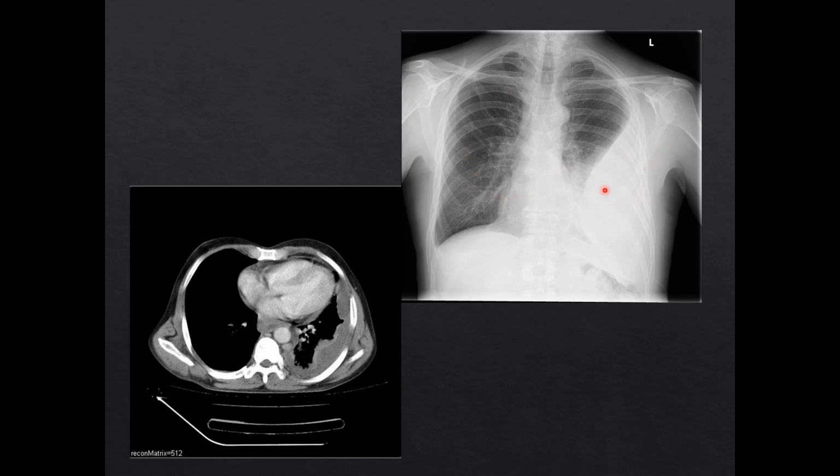Looking at the chest x-ray, for one, pleural effusions tend to be bilateral, while empyema tends to be unilateral. Also, with the pleural effusion, as we discussed, you tend to see that meniscus shape, and with empyema, you have more of an obtuse angle with the chest wall. On CT, you would tend to see a crescentic shape with pleural effusion, but with empyema, you have these convexities where there is a buildup of pus pushing against the lung.